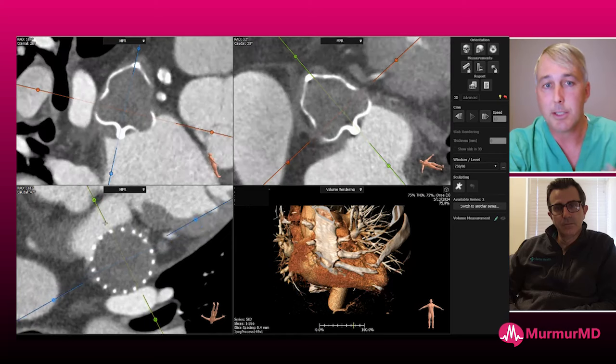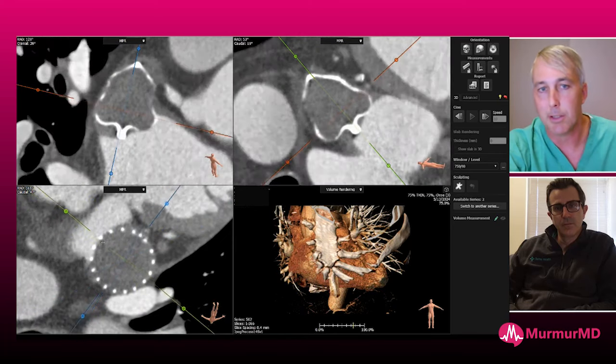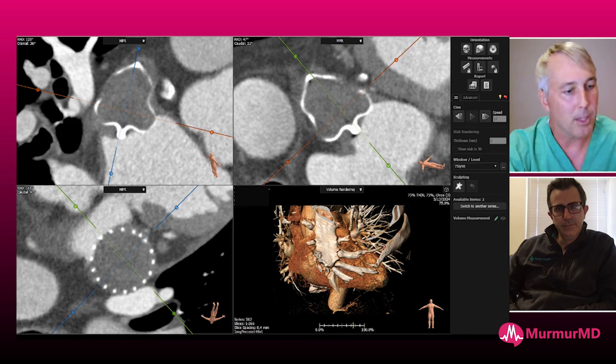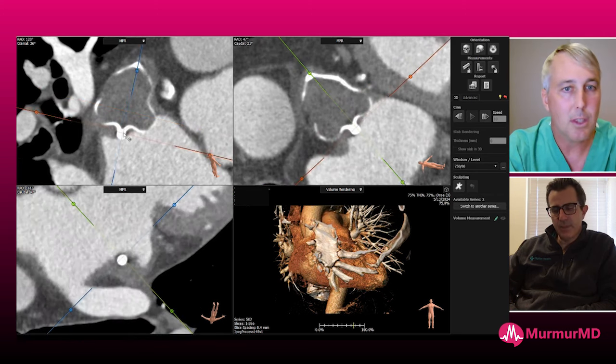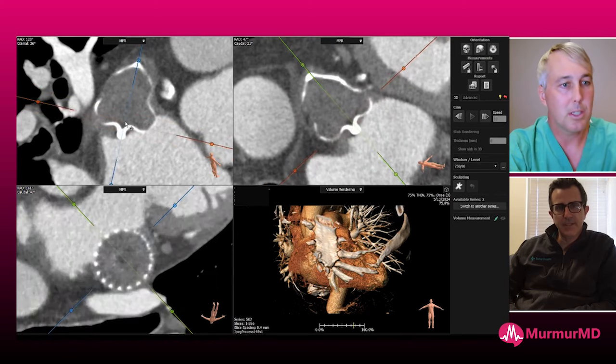So I bring this example up because it was read as potential device-related thrombus, but this is not, because there's not anything coming out jagged looking into the atrium. So keep that in mind, and I'll show you one that is thrombus. That spot there where the device is opposed to the limbus, that's been a spot where I've had a lot of ambiguity. Is that generally the case?